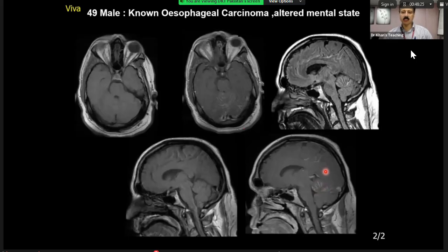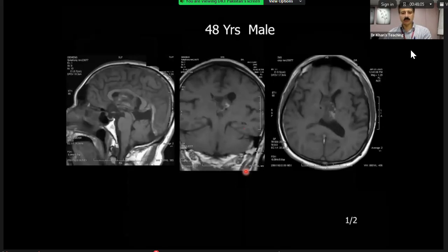So it has to be leptomeningeal, right? So please remember, the main thing we were learning here is high signal on the FLAIR. Once you pick it up, you give contrast, and if it enhances, your differential has to be something bad, infection or tumor carcinomatosis.